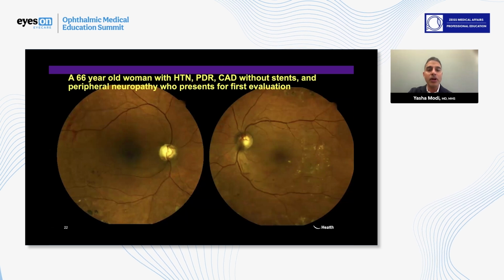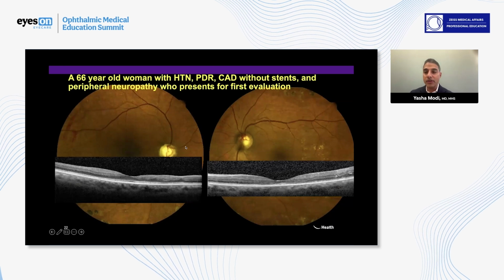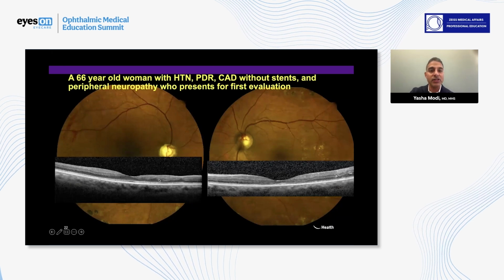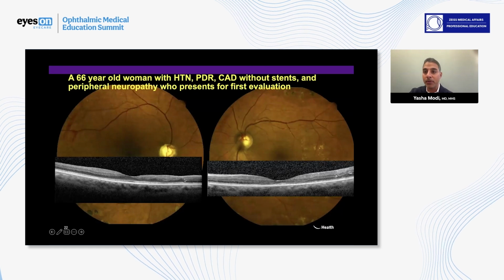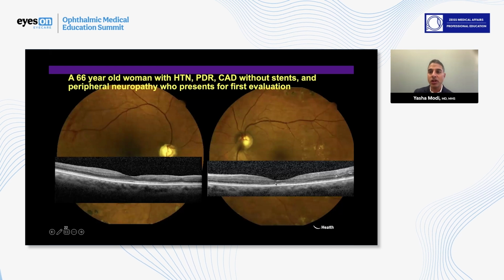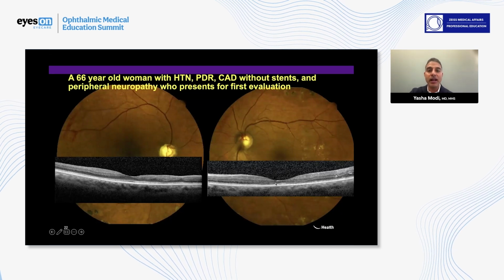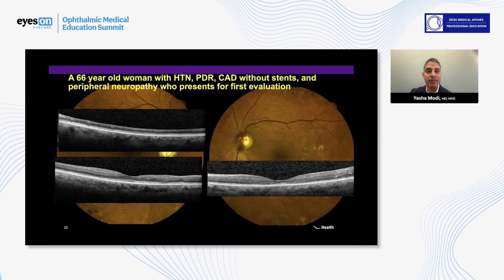It's easy enough to say, I'm going to chalk all of this up to diabetic retinopathy. If I look at the horizontal foveal slices, I can in fact see some areas of deep capillary plexus ischemia in the form of ripples. In the left eye, there are perhaps some ellipsoid zone changes indicative of some diabetic macular edema in the past with associated atrophy.